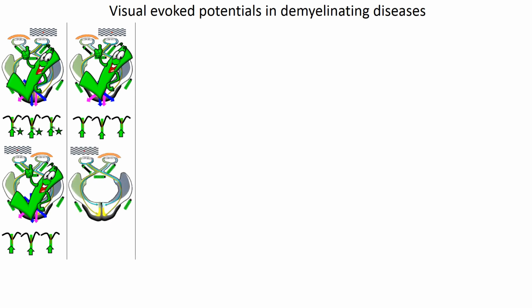If now we look at the left eye testing, that is the eye with the optic nerve demyelination, notice that all vectors here are represented by partially transparent arrows with shape outlines of the same color. We are going to use the transparent arrows to indicate delay vectors. Also notice that all the P100s, that is the sagittal and parasagittal P100s, are delayed to the same degree.